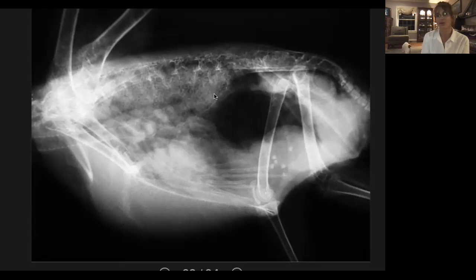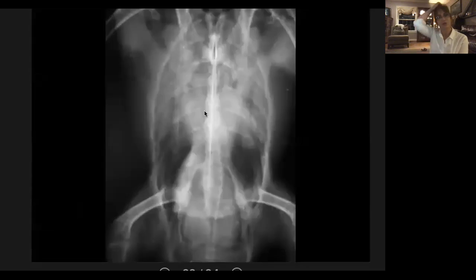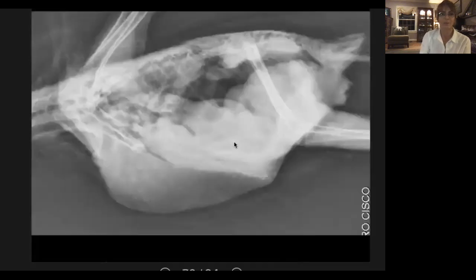It's very rare that you're going to have it all throughout the entire lung parenchyma, except in end stage type of disease. So here in these beginning stages, we just have destruction of that honeycomb pattern. And normally you can't see the lungs very well on the VD view, but certainly if there are things like granulomas, like we have right there, then you'll be able to pick those out.